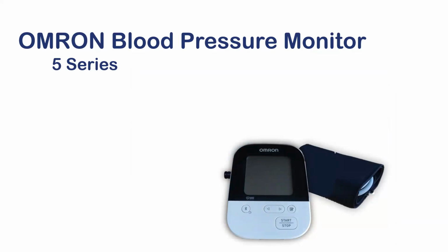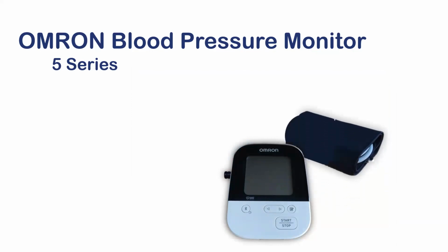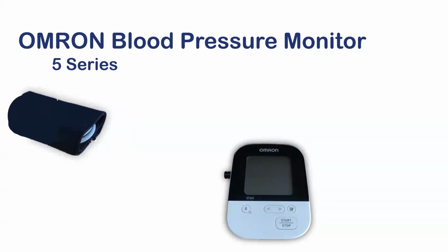After you have put the batteries in the blood pressure machine, go ahead and find your blood pressure cuff. Your blood pressure cuff will be connected to a long tube. Plug the other end of that tube into the blood pressure machine.